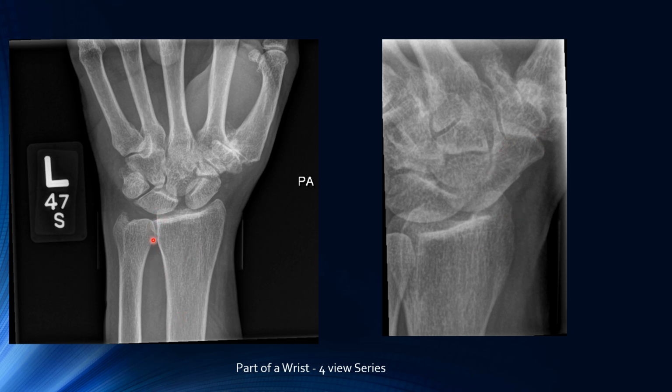Slight little bit in there, so it could be turned slightly. It looks like the hand is turned up a little bit, externally rotating slightly on this view. They have their fingers curling underneath. We are looking at the scaphoid. It seems to be pain around the scaphoid area, which is this bone here.